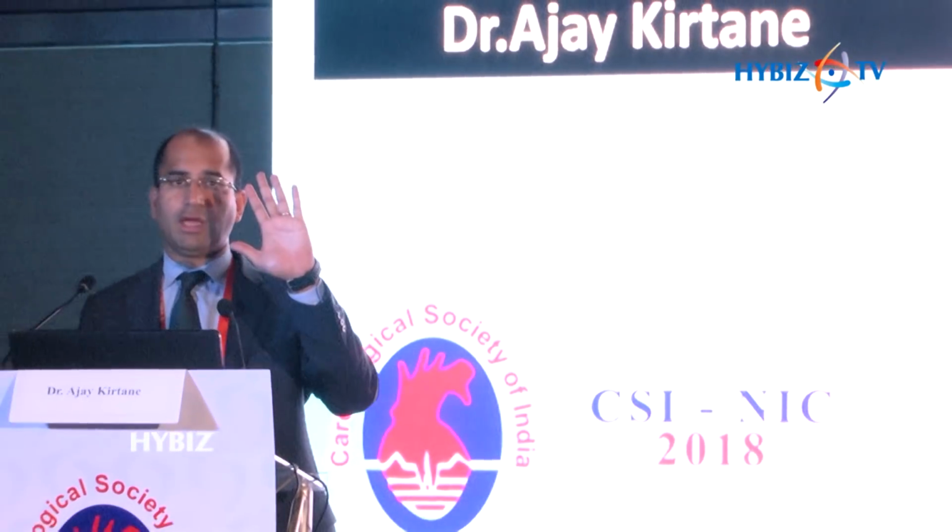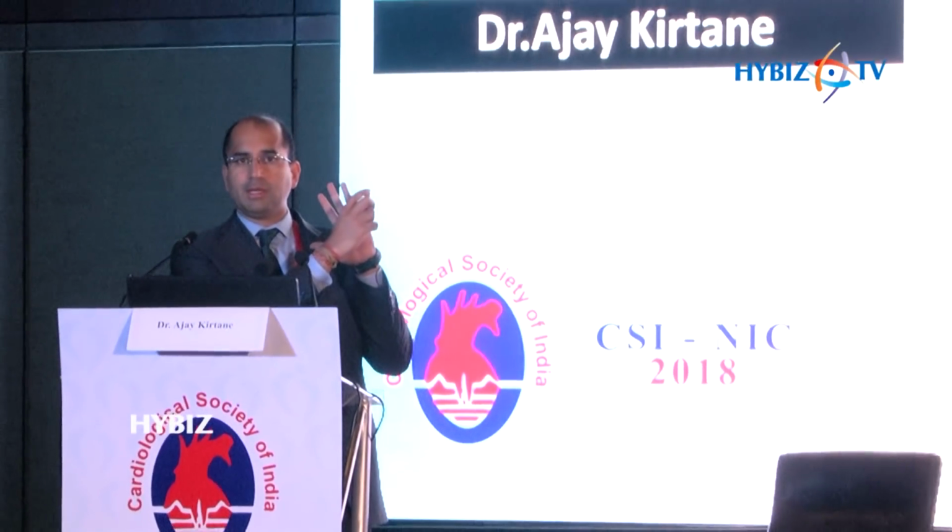Now, other things about the angiogram pitfalls are lesion length. So this view is very easy and straightforward to determine what the length of this lesion is. This view, this may be a little bit foreshortened, but if you wanted to measure this mid-LAD here, it would be very, very challenging. And so many people always ask, well, what is this thing called foreshortening? Why do we call it that? So basically, this is what it is. If you take your hand and you look at the length of your pinky, that length is a fixed length.